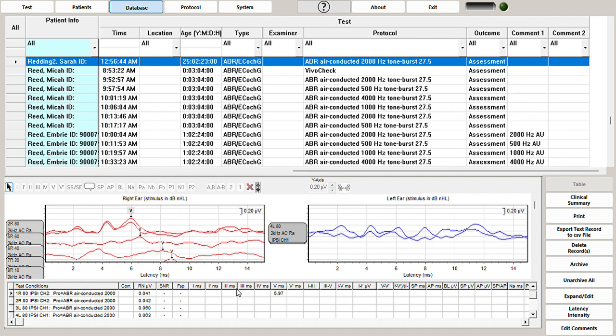If I look back down here, I can see this CORR. This is a correlation coefficient, and this is basically what your SSSE value is. It needs to be 0.60 or higher, and right here it's 0.85, so we're good. This is really important when we're looking at thresholds. So I'm going to place this on a few more waveforms here as we go down.